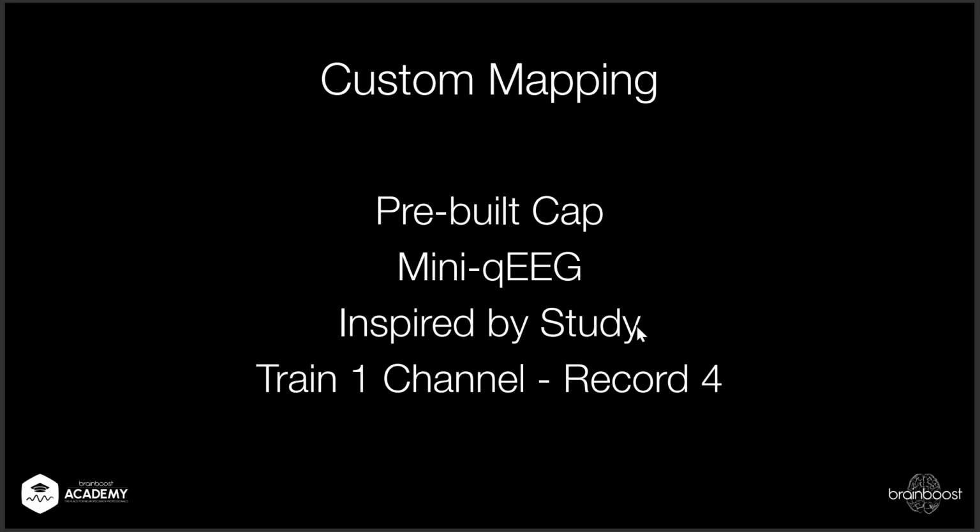It might be inspired by a study. You might have a pre-built cap with 8 channels, but not all positions are ones you want to use in a certain study. And maybe you want to train, for example, on 1 channel, but record 4 at the same time. So let's say SMR training, you train on 1 channel, but still you want to record 4 channels, and then later on maybe check out the frontal part, parietal part while you train on a central part.